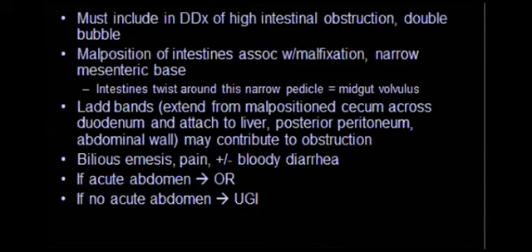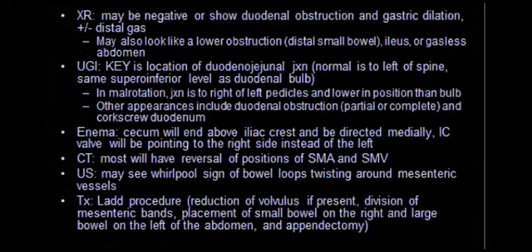Okay. So maybe just move on, and I think here, if it is Ladd band, we can just, okay, let's go to this case and show you this appearance.